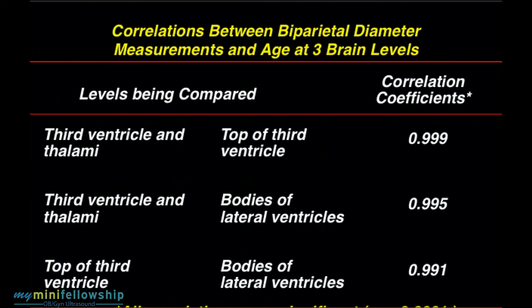Now, the way the nurses, of course, did it was to put the caliper to the widest point between the parietal eminences. So that is the way that ultrasonologists first began to measure the biparietal diameter. So they were looking for the largest measurement. So if they had measurements of 55, 57, and 59, they naturally assumed that 59 was the correct number.